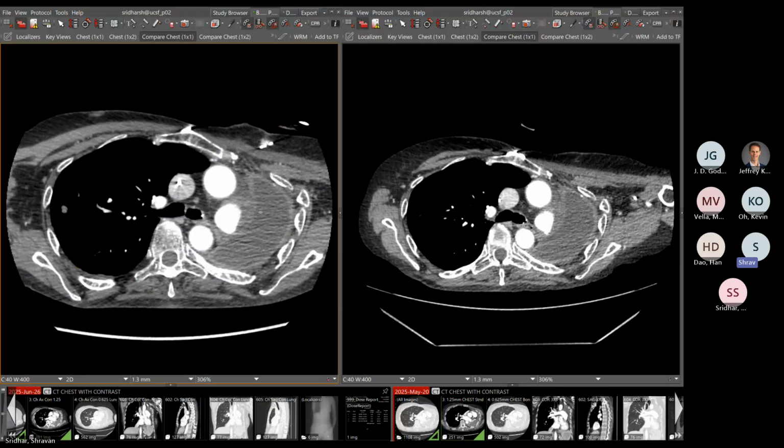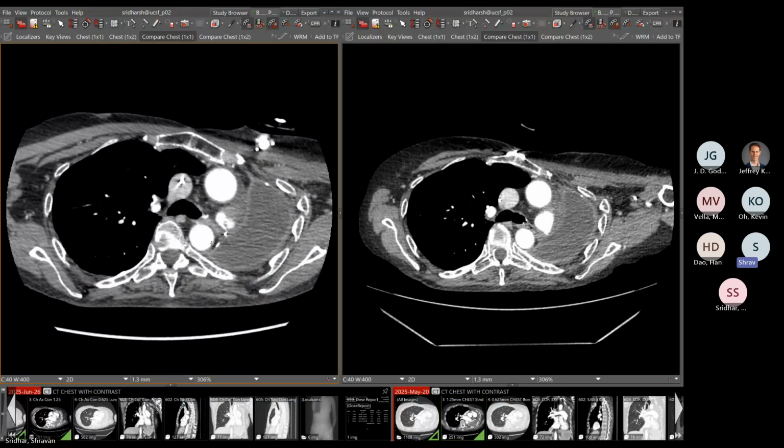And maybe that throws you off and you think, well, it's probably just a little bit of thrombus, we're catching it at a funny angle. But that's why it helps to look at multiple older scans and track what's been happening compared to more remote priors. So that's where we are. We don't have any other workup here. So today we are raising the possibility of a local recurrence.